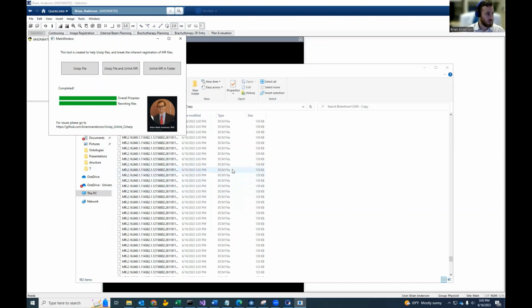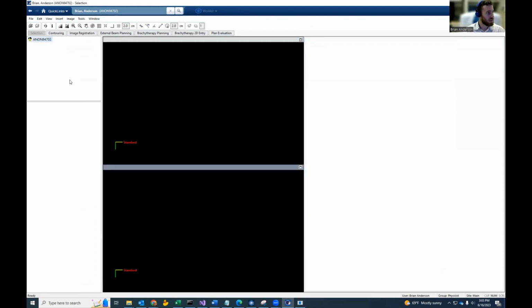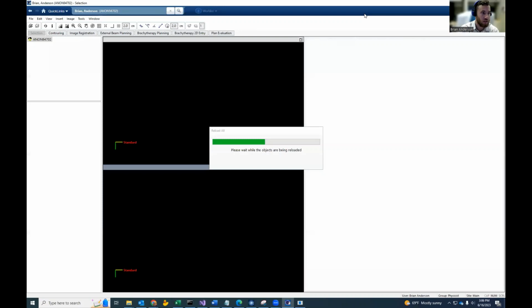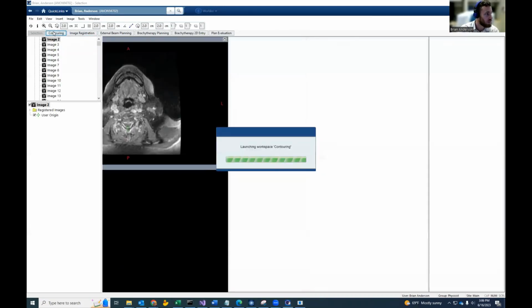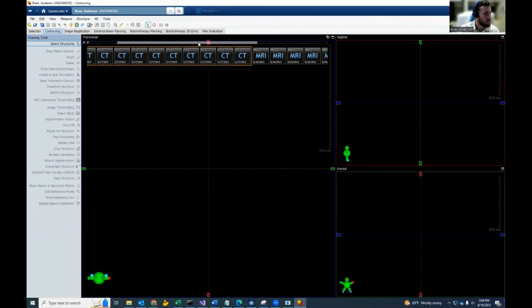So 303. Now what I'm going to do on this side next is I'm going to import these, but I'm going to pause the video because as soon as I click file, it'll show the recent patients in PHI. So I'm just going to pause here and then I'll hit play again once it's imported. Right, now that these have all been imported, I'm going to go over to contouring. And from here, we can see that the new MR images that have been imported are not linked to one another.